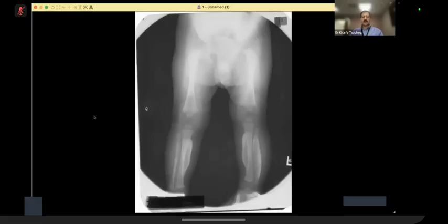so in this case, first of all, age. Please remember, the age you are going to tell the examiner. You cannot ask the examiner. Why? The femoral head epiphysis is not visible. What is the normal age of appearance? In girls, it is 2 to 6 months, so 6 months is a good point to remember.